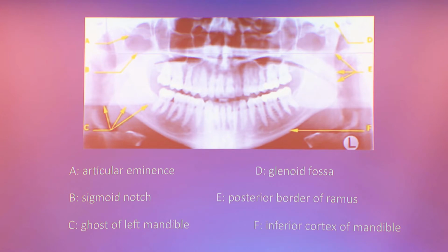And I think here too you can use this as a reference. So again, notice the ghosting. This is the ghost of the left mandible. That's the main takeaway here.